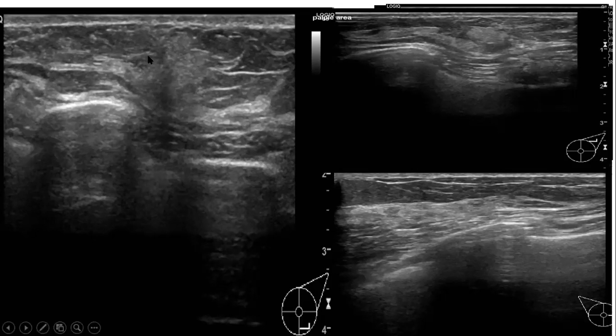But retrospectively, if we look for a hyper-echogenic lesion, to say a benign lesion or a parenchymal island, it has to be homogeneously hyperechoic. We should not see, okay, heterogeneity or hypoechogenicity within it, or any shadowing. If it is like that, it will not be just a benign lesion.